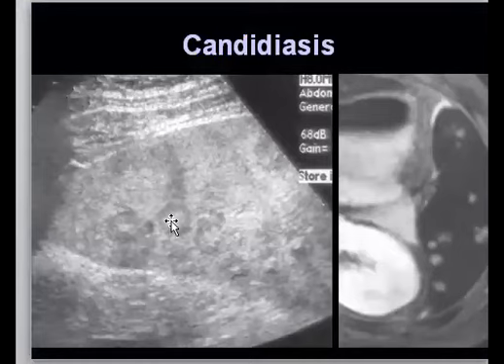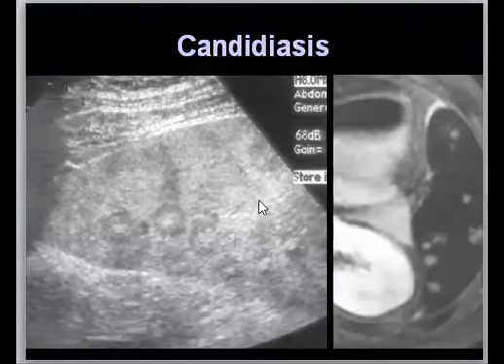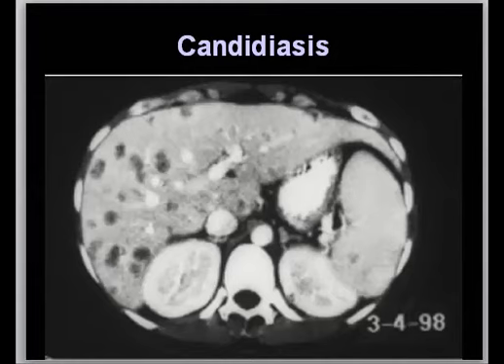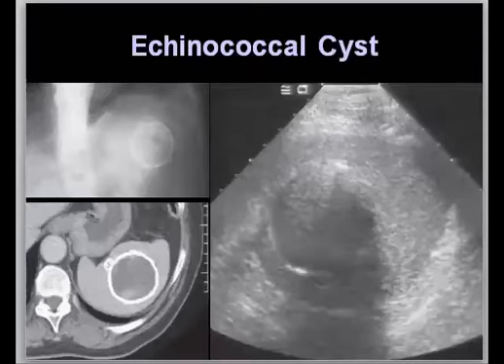This one in the spleen is not typical, but you can say it is candidiasis. And again, another appearance of candidiasis that can happen everywhere with infections. They say it looks like punched out lesions. But to be honest, if you are in the exam, both differentials, the mets and lymphoma, will be in your top differential. Then after that, you can put everything. Maybe from the history, you can know it.